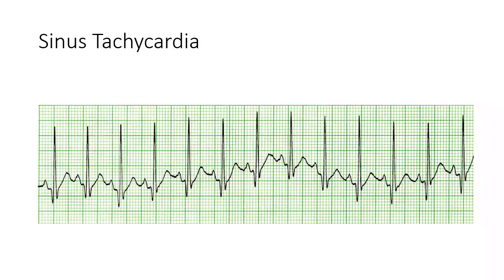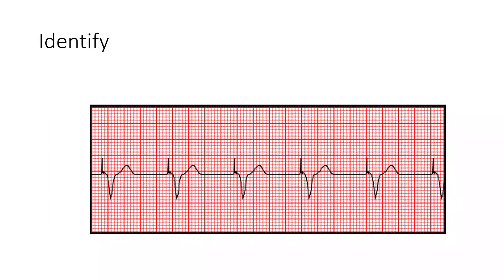So you see, name that tune. Not idioventricular. Anybody know? Is it pacemaker? Is it, well, pacemaker because of spike? There you go. Okay. All right. That's my second guess. But yeah, sure. Yeah. So yeah, you're exactly right.